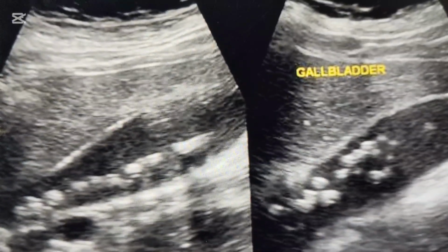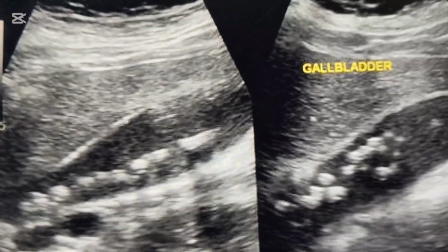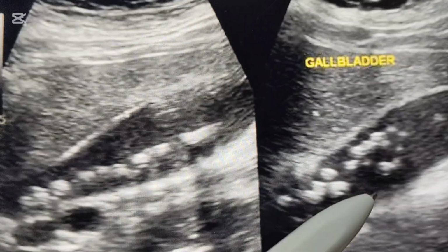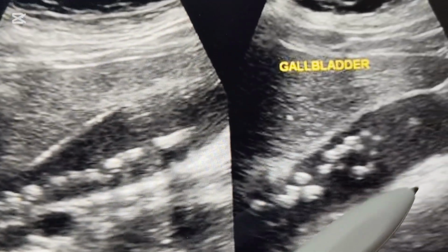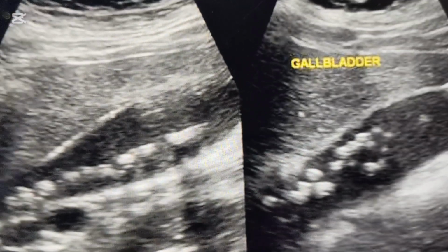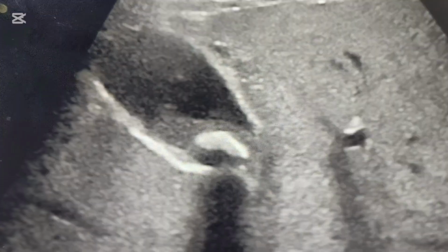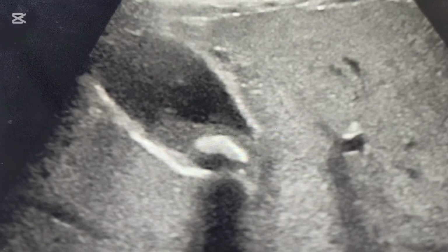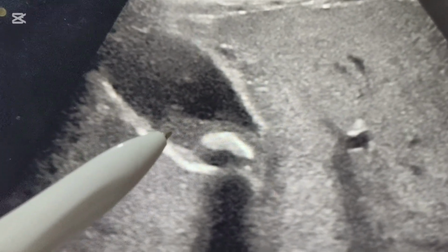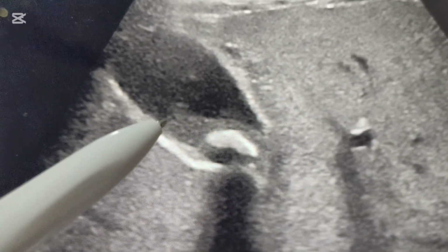And these two images show GB sludge with multiple gallstones. These are gallstones mixed with GB sludge. This image also shows gallstone mixed with GB sludge, full of sludge and gallstones. This is another image showing GB sludge. This is sludge and this is gallstone present at the neck of GB.